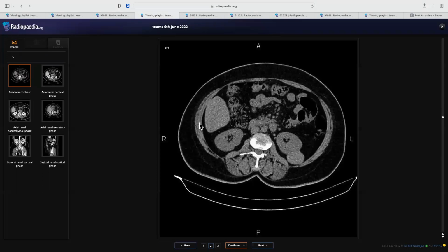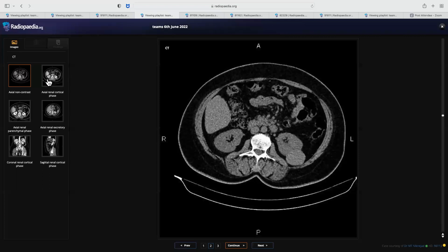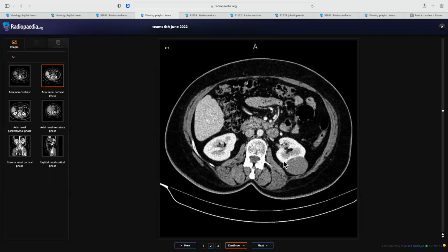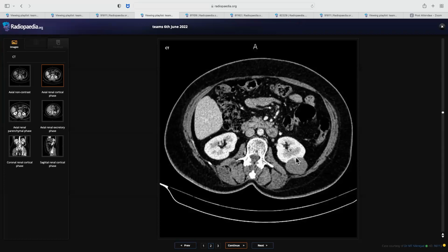Regarding this case, you said Bosniak type 4, yes, but once I prompted you. See, these things you should better not miss, because once the examiner tells you and then you pick up, then of course the score would not be that great. If you do it on your own, then definitely it's better. So once you saw that, you said Bosniak type 4, which was absolutely fine.